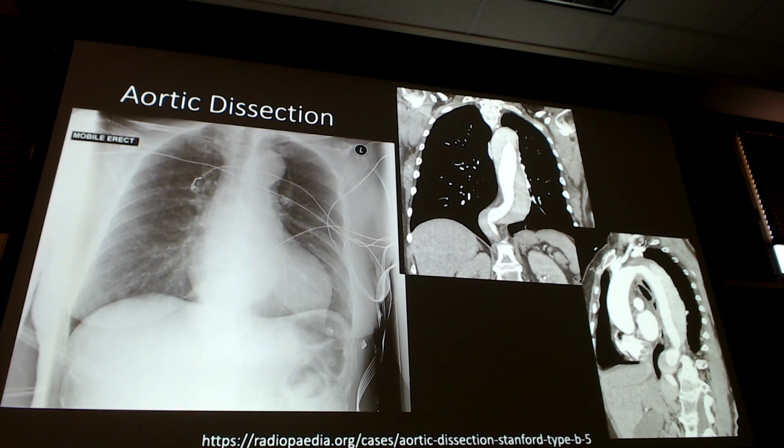If this were just an aneurysm, you would just have a really wide aorta, and it would be all the bright white contrast. But it would be much larger than some of the normals that we've seen. You wouldn't have contrast in a second area sitting posterior to it or around it right here. Which is why that sagittal view is going to be one of the best views to look at to see this, because here I'm like, what is going on around the aorta, right? Especially at a beginner's level. But then when I see this, I can think, oh, there's my layer, and I've got contrast right behind where the main aorta is supposed to be. Does everybody see that?